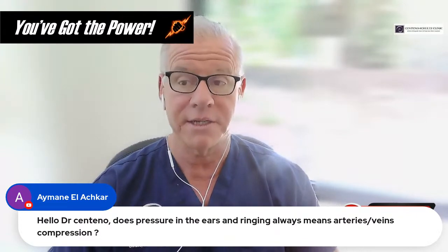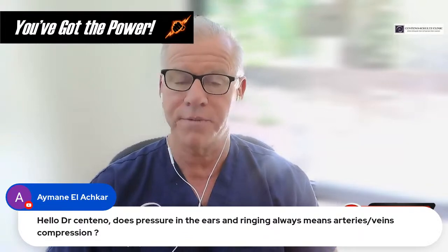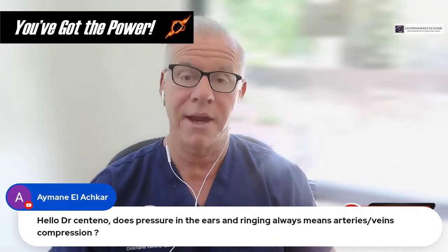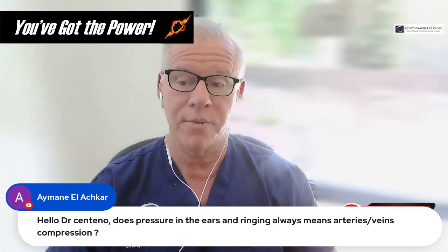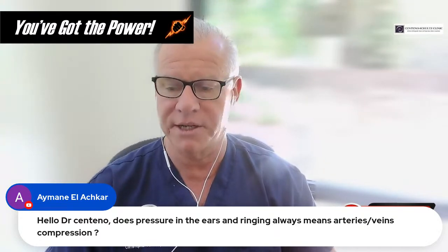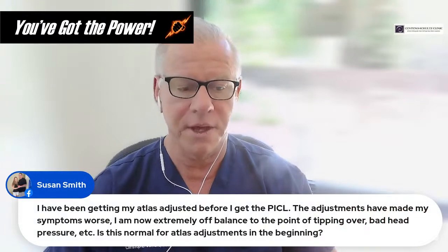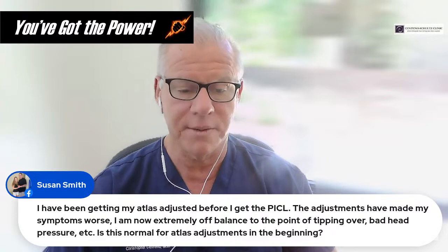And then we get into saying, okay, are these upper cervical related issues? For instance, for tinnitus or ringing in the ears or pulsatile tinnitus, we know that craniocervical instability, as we've talked about here, can cause intermittent compression of the internal jugular vein. So if we see that in addition to instability, we can say, yeah, that makes sense. What we're seeing on this image seems to cause the symptom that you're reporting or is likely associated with it.